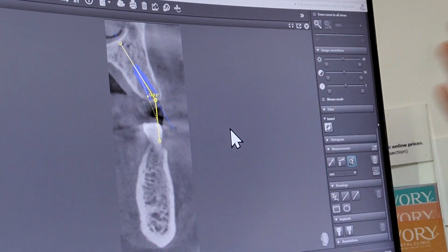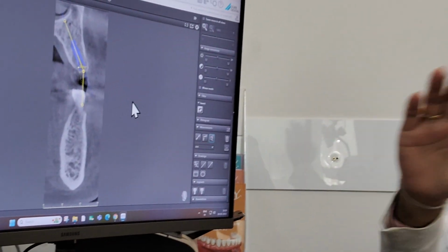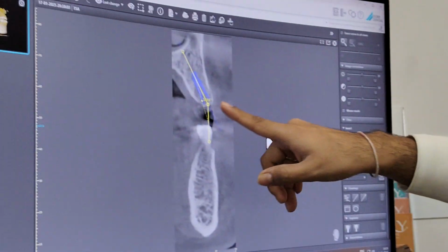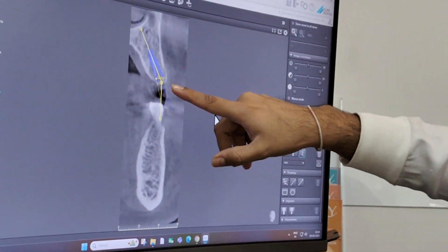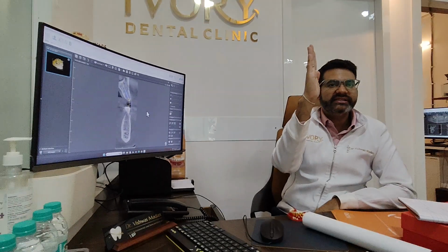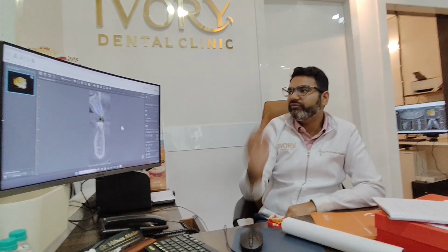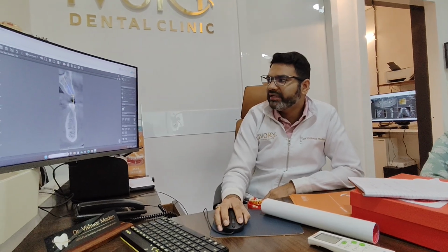So how much angle we have to make our implant handpiece or drill is 149 का उल्टा, मतलब it is 30 degrees. 180 होता है ना total. तो 180 minus 150 is 30. तो we have to make it 30 degrees. तो ऐसे जाना है, तो सीधा तो नहीं जा सकते, बोर्ड है ही नहीं इधर, तो we have to tilt. So how much tilt we have to do is what this is telling us. So this we can approximately make 30 degree.